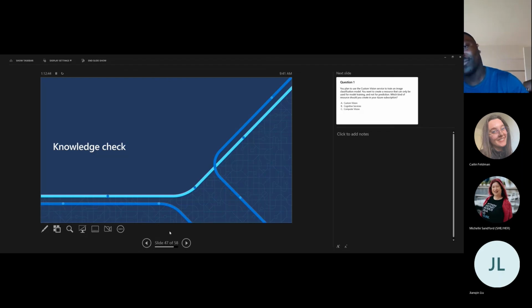Again, if you go back to the problem, rural areas may not have access to ophthalmologists or those facilities where they can get all these services. If you have a machine learning model accessible via Power Apps, all you need to do is upload. Yes, you still need to upload an image, but you can have a quick test and see, okay, this is a good chance, this is a positive DR test, this is a negative DR test. You can do that just from the data collected previously.